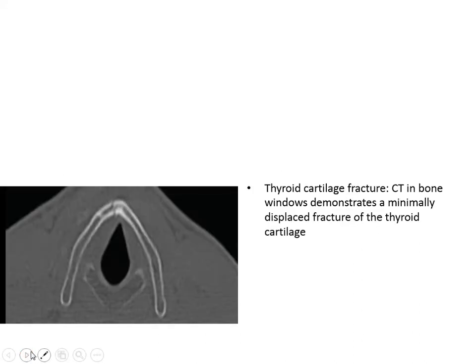Thyroid cartilage fracture CT in bone windows demonstrate minimally displaced fracture of the thyroid cartilage.